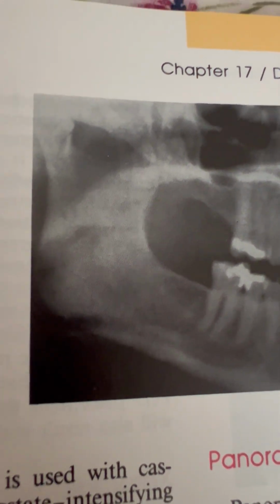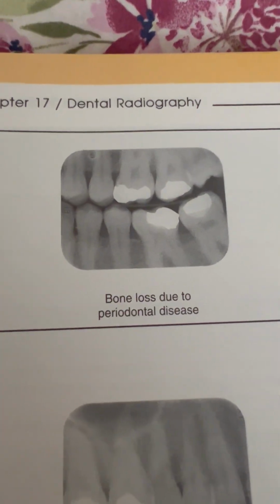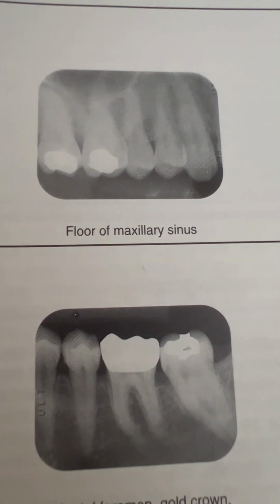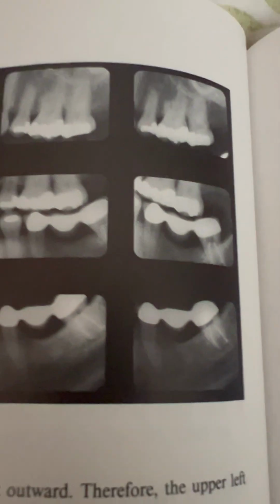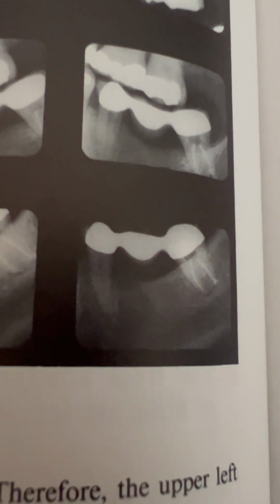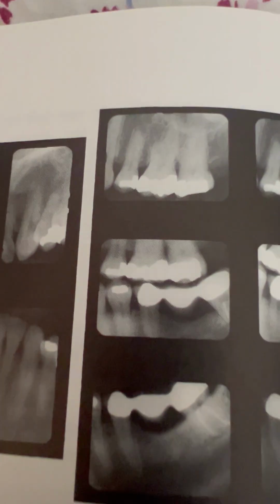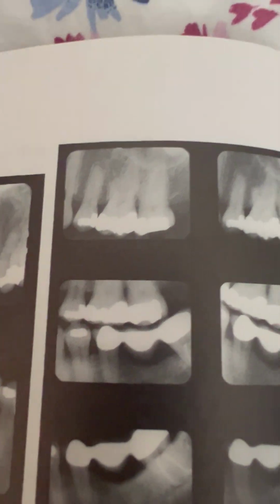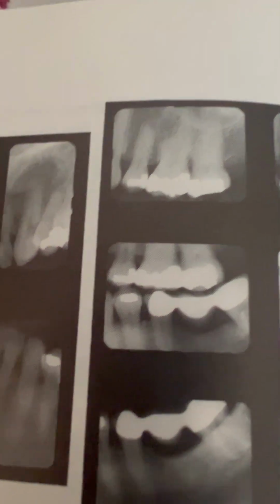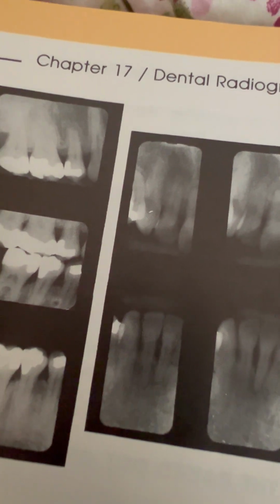So when you see them on your next dental visit, you'll know exactly what the upper and the lower look like, because you'll see that smile line. Based on that cobweb consistency, that's the lower. And based on this line, that this is the sinus, right away you know that this is the upper. And how you can tell left from right, most times they have them numbered.